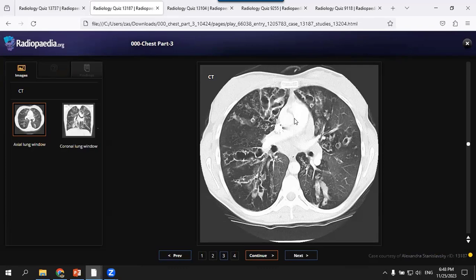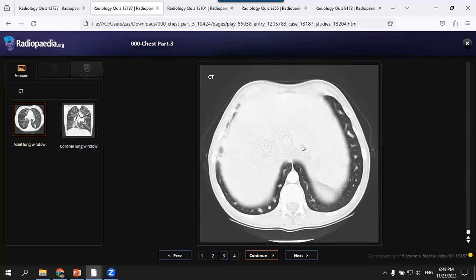Why do you want to see the mediastinal window? If there is allergic mucoid impaction, or anything in the abdomen, complications, if there is portal hypertension or lipomatous replacement of the pancreas. Very good. You have to mention this to complete your case.